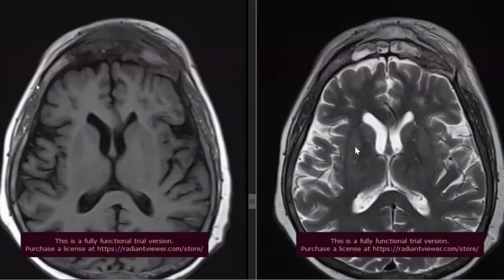Okay, so these are the axial sections from the T1 and T2 MRI brain examination. On this scan, I can see that there is abnormal signal intensity involving the frontal sinus bilaterally. It is hypointense on T1 and heterogeneously hyperintense on T2. I can see that there is also associated overlying soft tissue abnormality as well. And the bone around the frontal sinus also appears to be abnormal.